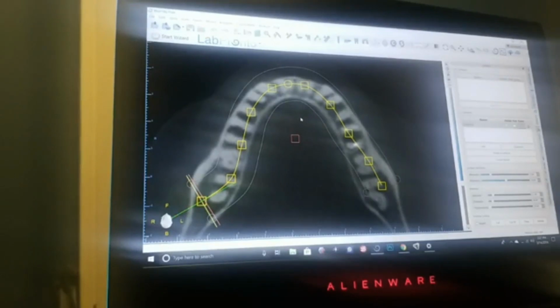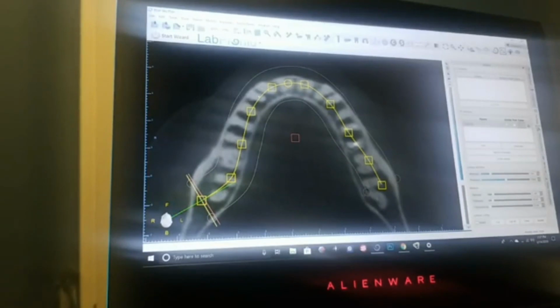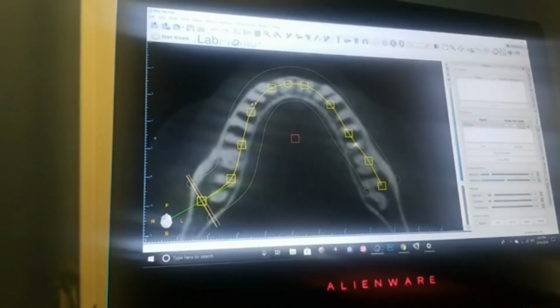Okay? So for example, I want to look at this image here. Can you see my cursor, everybody? Take a look at my cursor. I want to look at this area of the jaw. I click on it. You see what just happened? It's a whole area that just kind of moved into this bunch of lines. Come over here. I want to look at this area. Okay, I click this. Oh, I have all those lines coming back here. I want to look at here. So you understand, you want to see something, click on it.